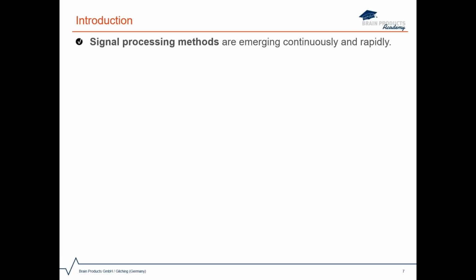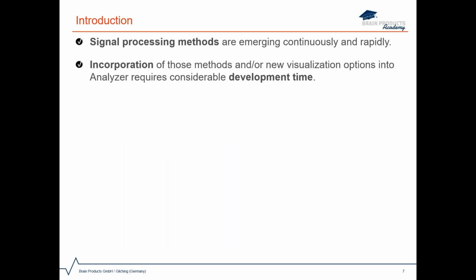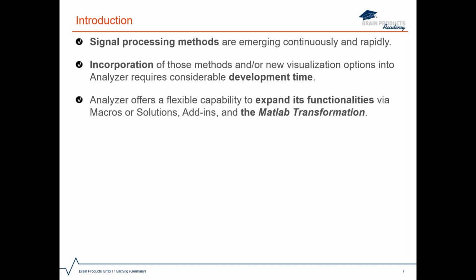Signal processing methods are emerging continuously and rapidly. Incorporation of those methods or new visualization options into Analyzer requires considerable development time. Analyzer cannot have all of them. However, Analyzer offers a flexible capability to expand its functionalities via macros or solutions, add-ins, and the Matlab transformation, which is the focus of this webinar.